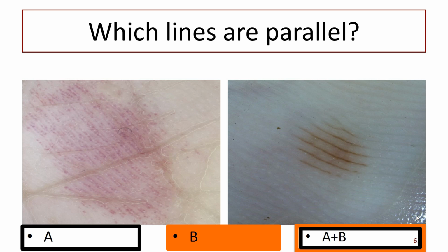The lines are skin coloured between what? Remember, I'm not going to talk about skin colour because that's background. I'm going to be talking about a colour. So the colour is red or purple. What do you know that's red or purple or blue? Vascular.